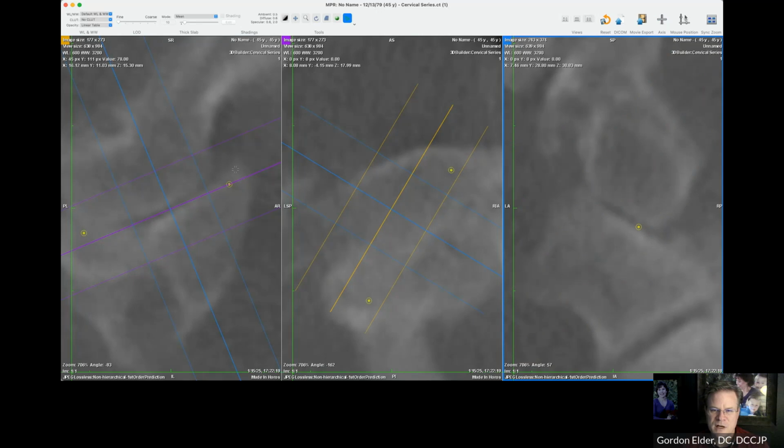See, look here, outside edge, further out, further forward on atlas to the skull. All right, so we're going to look there, look here. Not real clear, is it? I mean, that could be an overlap. We could have the bone has moved to the left on both joints.